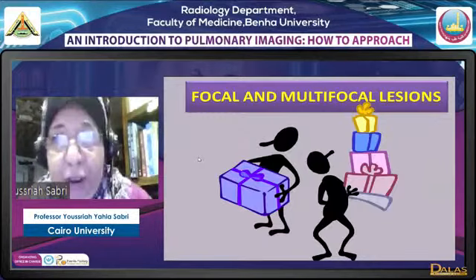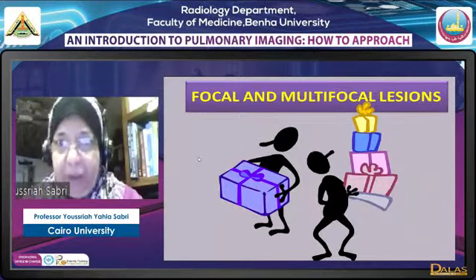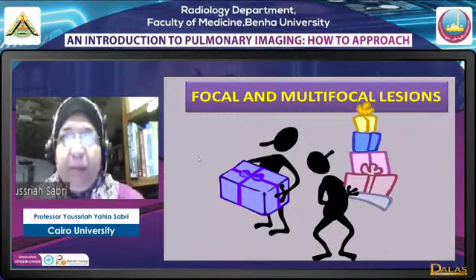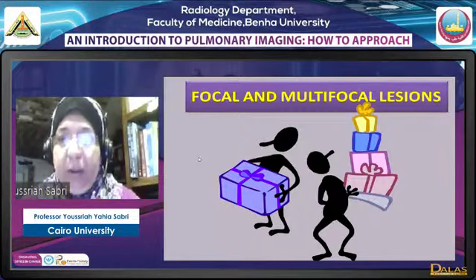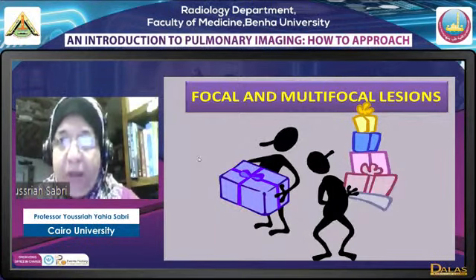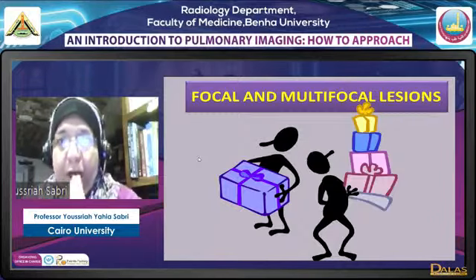نبتدي بقى نابروتش اللونج ليجنز. الدخله بتاعتنا اللونج ليجن is a practical approach meaning I'm not going to say congenital traumatic inflammatory مش عارفه ايه، لا، لما بتبص على فيلم او حاله ما بتطلعش تقول لك انا congenital ولا inflammatory، بتشوف ليجن وبتبتدي تفكر الليجن ده possibilities بتاعته. فاحنا هنابروتش ليجن وايز.